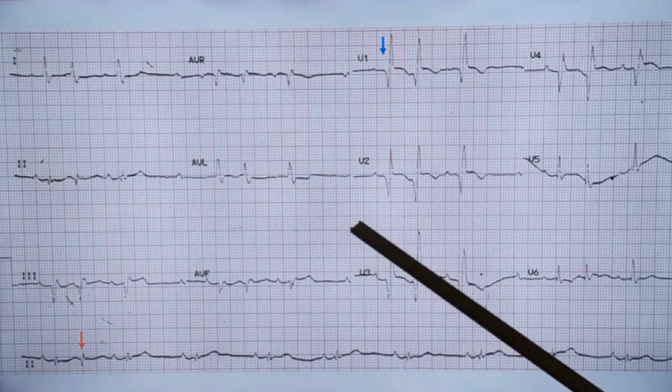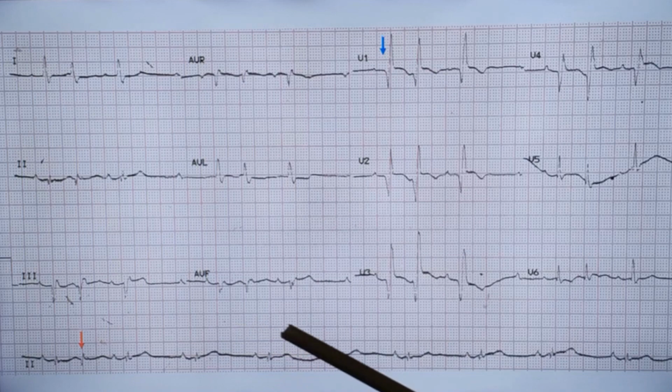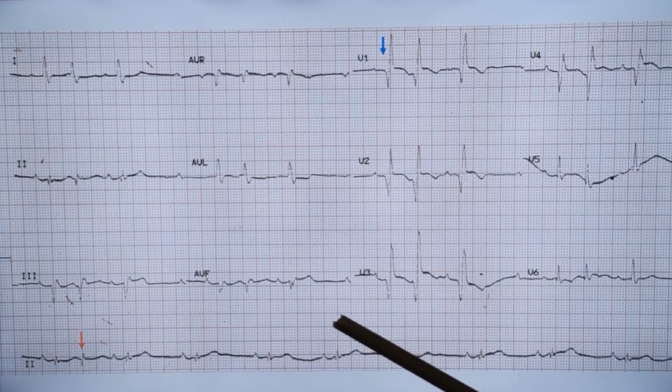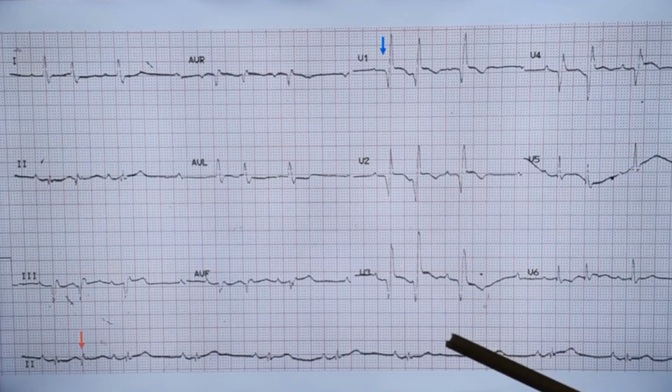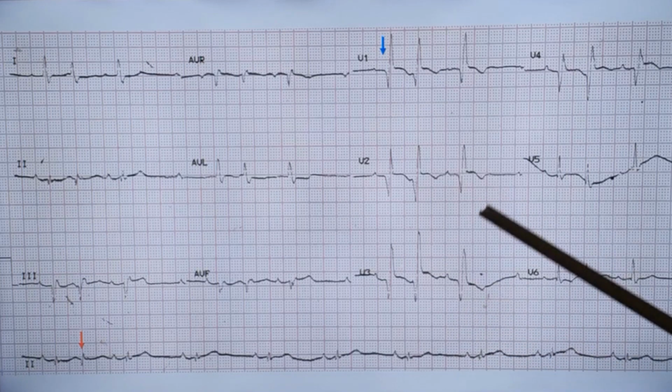When such a case goes for a complete heart block, the prognosis will be poor because the block is infrahisian, below the His bundle, so they can have a low ventricular rate. The escape rhythm is from the lower part of the ventricle, so it will be a low ventricular rate, with more likelihood of developing Stokes-Adams attacks if this person goes to complete heart block.